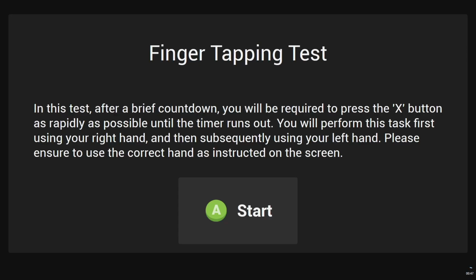The next test is the so-called finger tapping test. By the way, one thing, this is all in English. So we have translations of the BrainAssistant. There's no German person in this call, obviously, but if you change the language of the BrainAssistant to German, this also will automatically turn into German. I don't know about the other languages. We have many different languages in this call here.